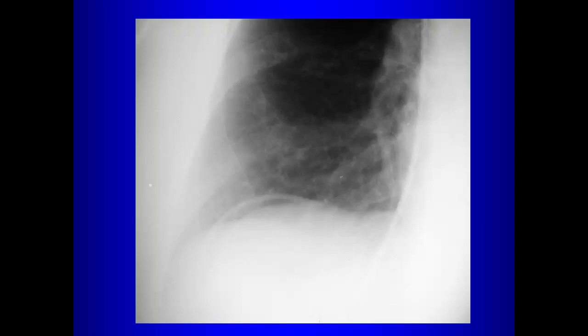Gastric ulcer, perforated gastric ulcer, because that perforates into the peritoneum. The duodenum tends to perforate into the retroperitoneum. But any perforated viscus can give you pneumoperitoneum. On the other hand, if you have an inpatient with pneumoperitoneum, think of iatrogenic causes.